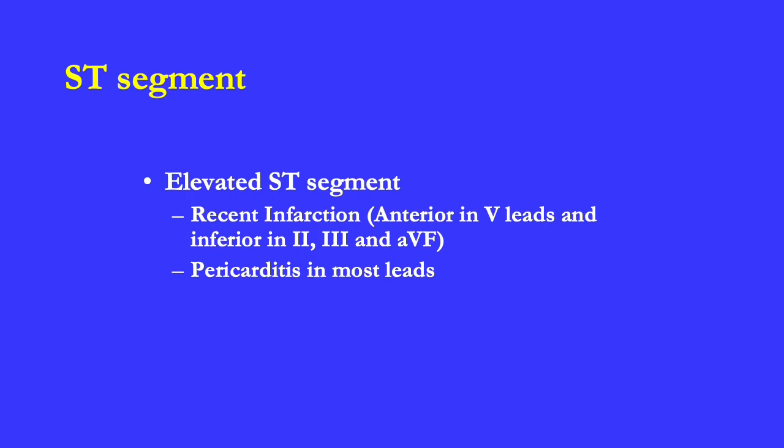The other reason why the ST segment can be elevated is in pericarditis, and often it is seen in a condition called early repolarization, which is normal.